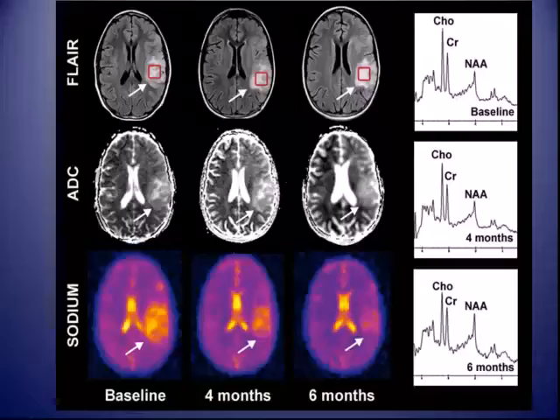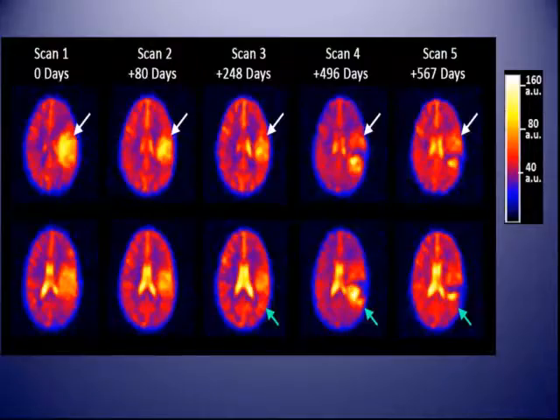This is an example of one of our cases that was on the immunotherapy protocol where there was a concern for pseudoprogression on one of the follow-up scans, but the sodium is really nicely showing a response. And so I think there's some value to this. We're still trying to figure it out.